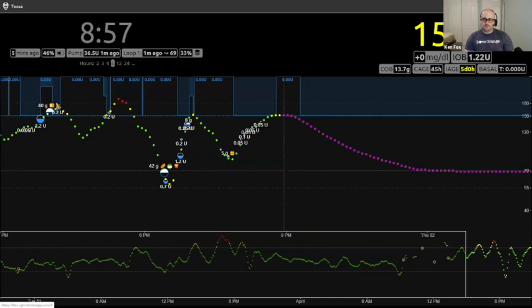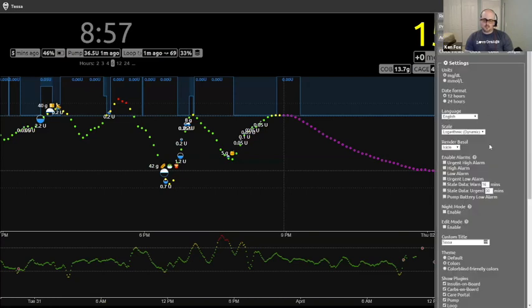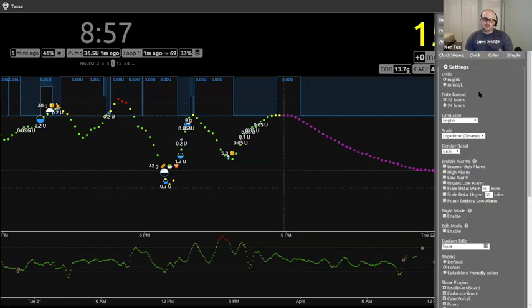So menu. We talked about most of these things here. What I want to show you is you have the reports, you have the profile editor. Make sure the clocks, because they're quick. So under clock view, you can click the clock, the color clock, or the simple clock. I like the color clock.